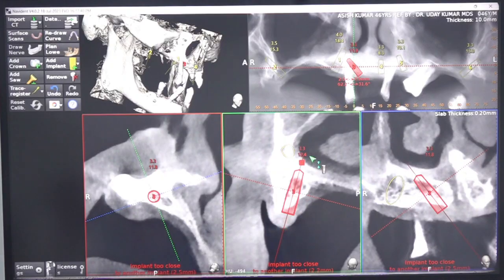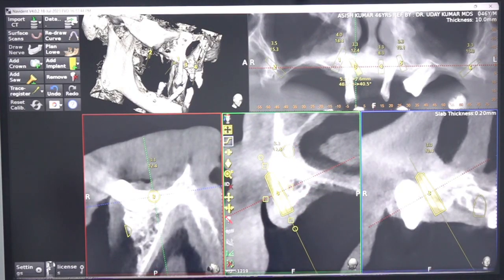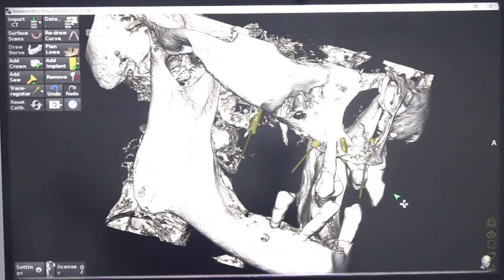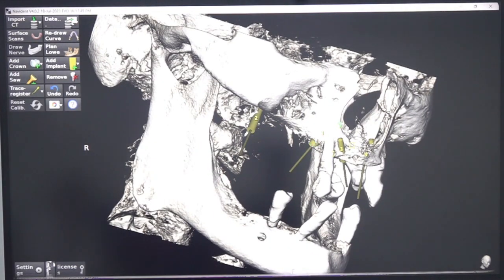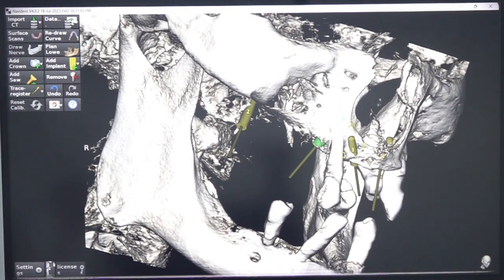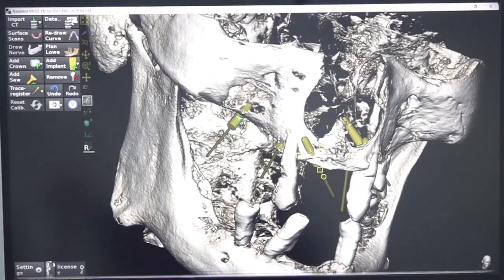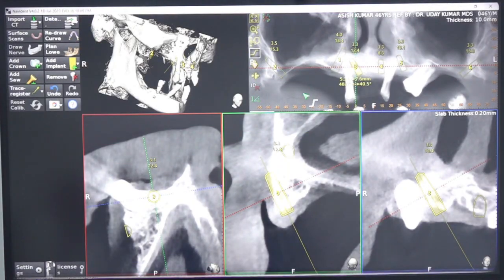Okay. So something similar, it is a kind of M approach. So for the distal tilted implant, the target point will be here, the axial implant target point will be here, almost closer to each other. You have to use the angulated one. So this is one option. We will see the left tilted implant. Left tilted looks more challenging.